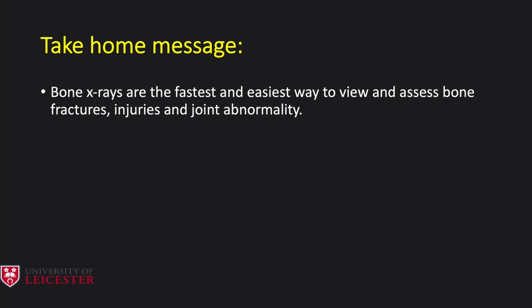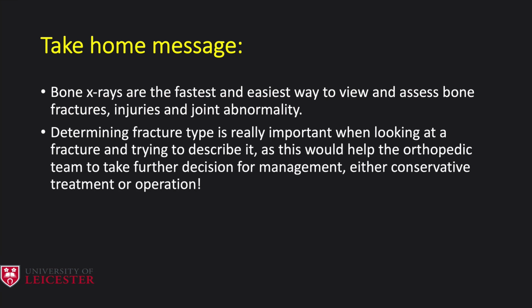Take home message. Bone x-rays are the fastest and easiest way to view and assess bone fractures, injuries, and joint abnormality. Determining fracture type is really important when looking at a fracture and trying to describe it, as this will help the orthopedic team to make further decisions for management, either conservative treatment or operation.